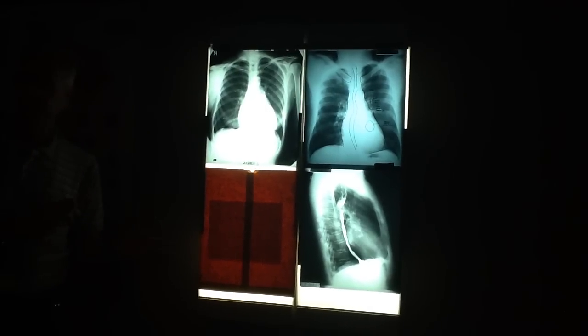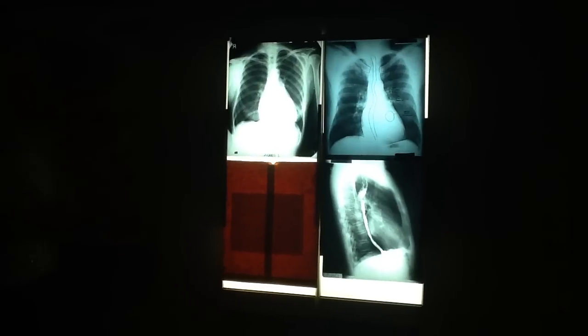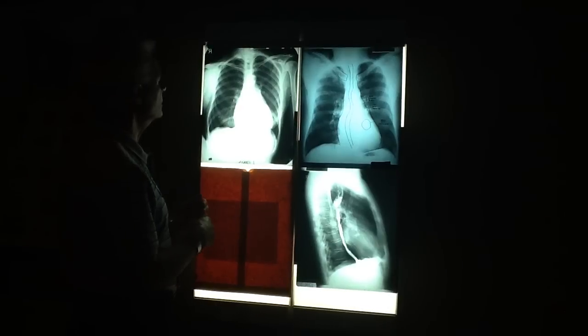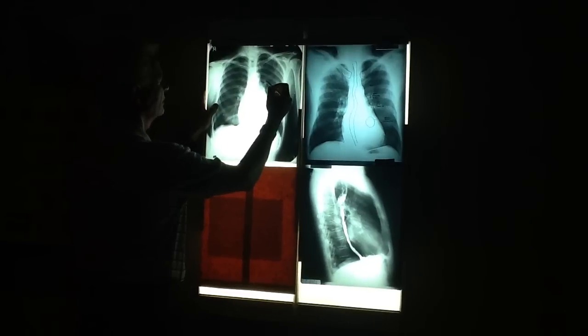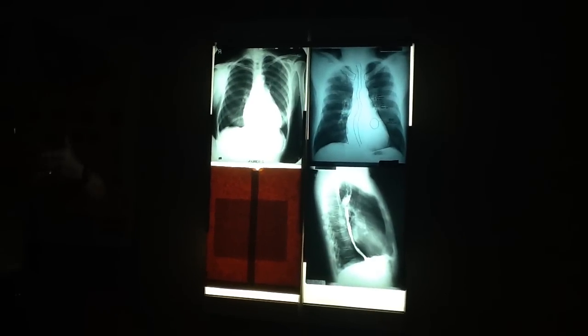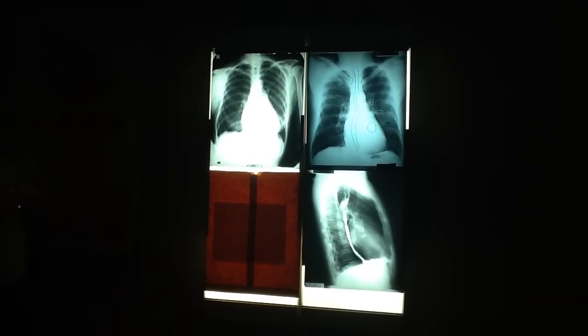So today, it's more common to have an enlarged left atrium because of an enlarged left ventricle. Things are just backing up. So this is an enlarged left atrium and likely related to mitral stenosis. There is a little bit of vascular engorgement, not a great deal of prominence of the upper lobe veins. Remember, heart can cause venous hypertension. It just backs up from the left side into the lungs.